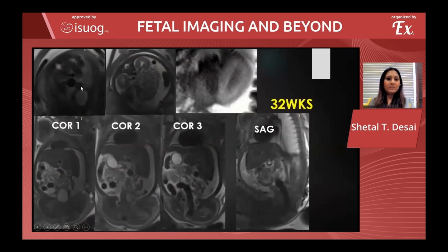On MRI, a structure is seen interposed between the rectum and the bladder. On coronal, you can very well appreciate that. This is an anteriorly placed bladder with a retort-shaped structure with the two cornua of the uterus, likely a didelphic uterus, with the normal signal intensity of the rectum, which instead of going straight into the perineum is seen to turn anteriorly, which tells me that this is a cloacal variant of urogenital sinus with ambiguous genitalia. You have ascites and bilateral renal pelvic dilatation.